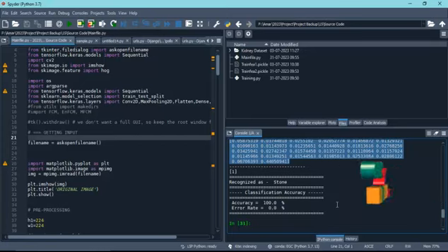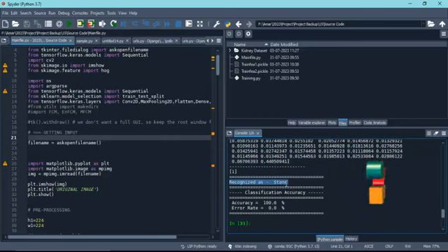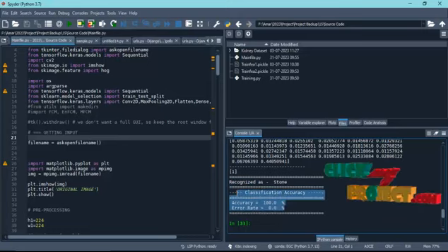After doing the feature extraction for everything, we do the classification by means of machine learning, to identify whether the input image is a stone image or not. After doing the classification, the accuracies are displayed here.